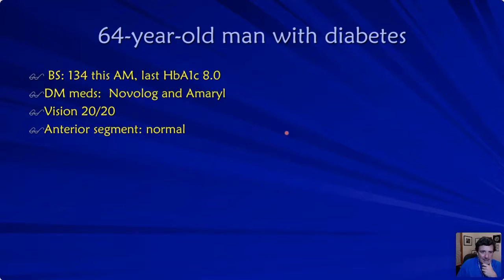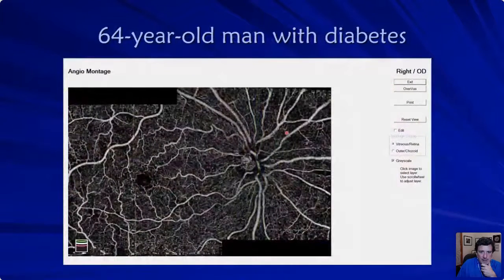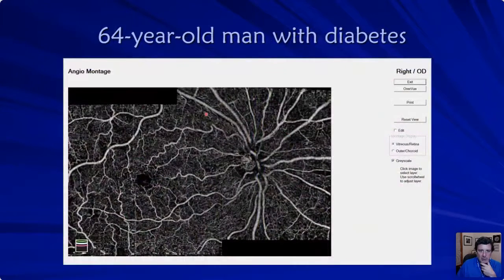With that being said, I know we're getting close to time, and I want to go through the Plaquenil. So let me click through here and show you this case at a rapid pace. I think you've seen enough. This is another patient with diabetes. You can montage them, show them how their capillaries are being damaged, explain to them that it's happening to their eye, it's happening to their fingers, toes, their brain, their heart.